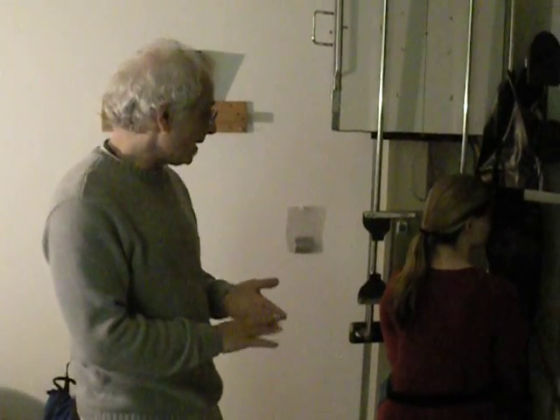And with it, we would do the right anterior oblique position. It's always a bilateral study. The cervical spine, 7 views. A Davis series. I don't know who Davis is, but it's a Davis series. Thank you.